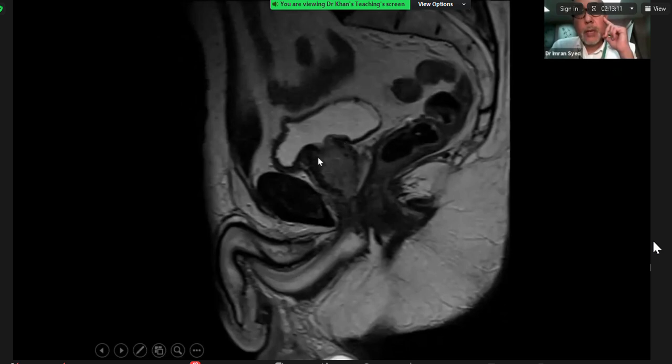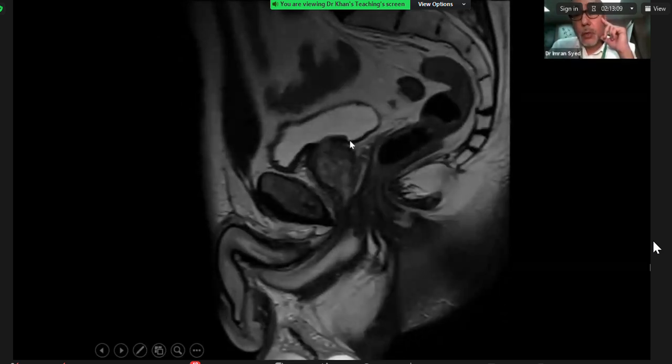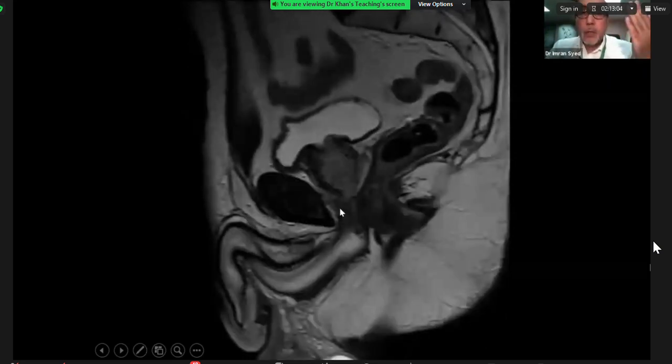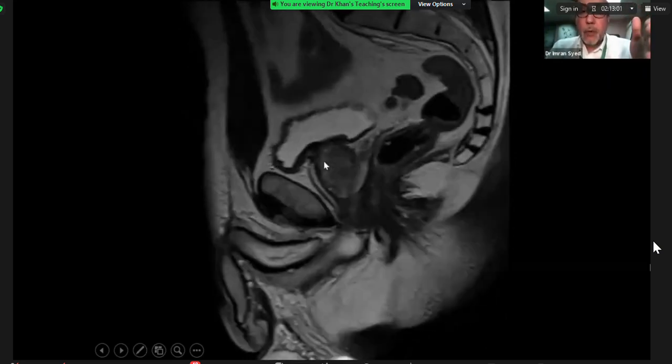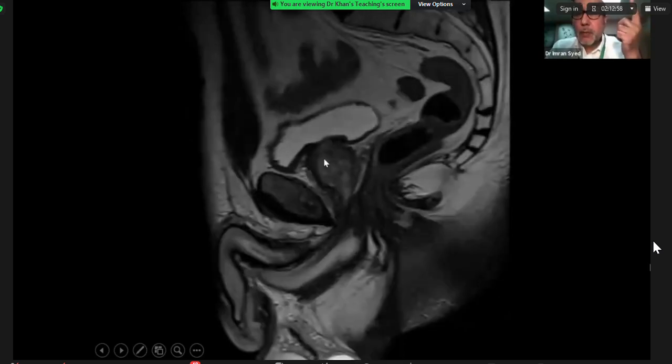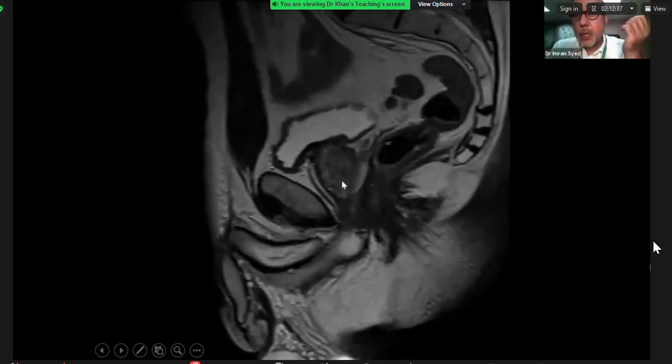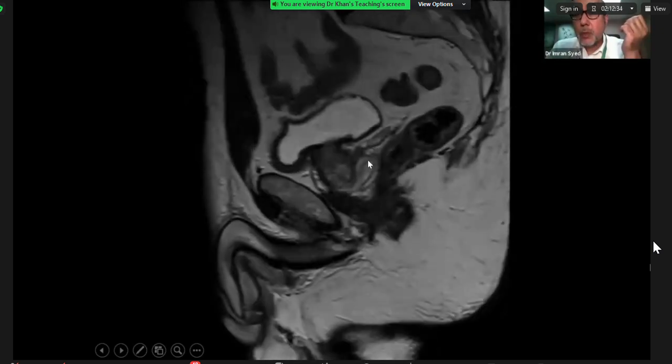Median lobe projection into the bladder, and also whether you have visceral invasion of the bladder neck. That's very crucial as well. So get into the mode of looking at the sagittal sequence for definition of whether there's visceral invasion of the bladder, whether there's seminal vesicle involvement, the definition of the seminal vesicles, and look for symmetry on either side. As the seminal vesicle comes down, it tapers down, and that tapering effect should be present. If that tapering effect is gone or blunted, then that implies that you may well have a malignant process that's infiltrating the base of the seminal vesicles on either side.